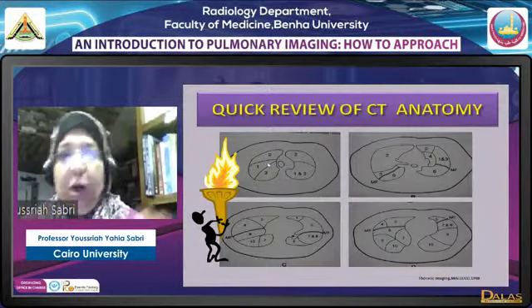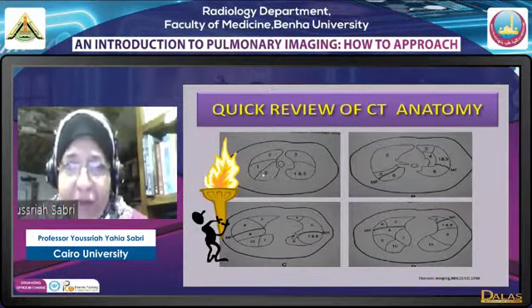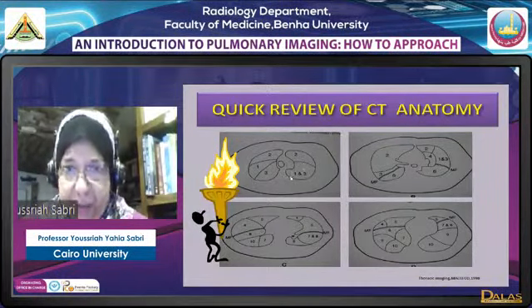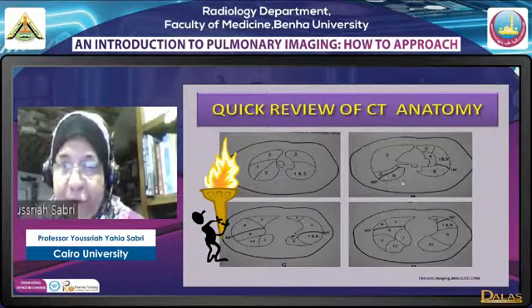الابر لوب فوق خالص في الكاتس الفوقانيه خالص are apical segment. Then I have بعد كده عندي upper lobe anterior segment, anteriorly, posterior segment, posterior, and an apical segment in the middle. While on the left, anterior segment and apico-posterior segment. Right. Then we have the fissures. بعد كده few levels, a few cuts later, we have the major fissure appear.